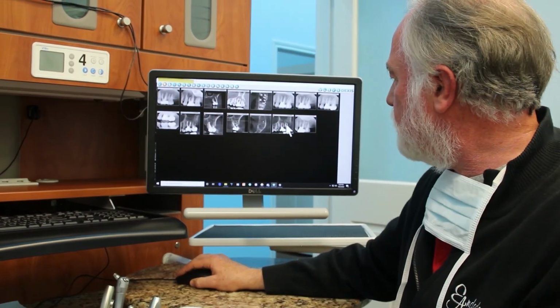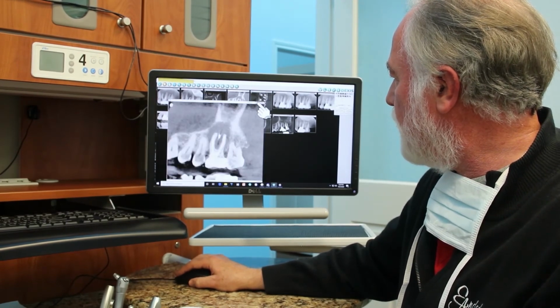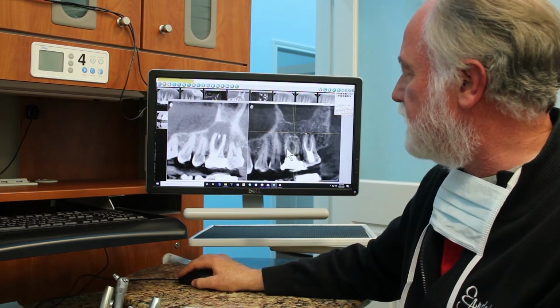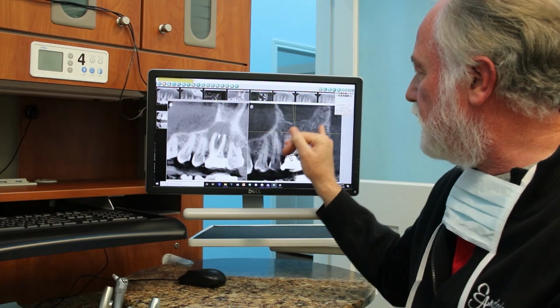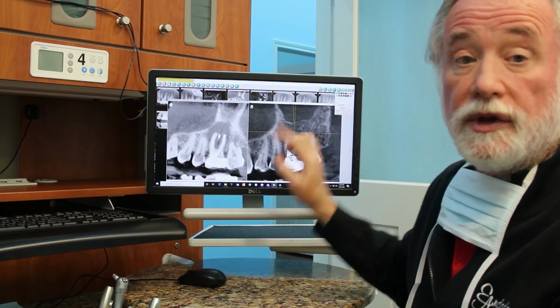We can see the tooth, the side view of the tooth was here, remember? Back in 2018. Today, let's take a look at the same CBCT. So again, you can see how this is not quite exactly the same angle. The roots look slightly different, but you get the idea how all this bone has grown back in, how the floor of this sinus has reestablished itself.